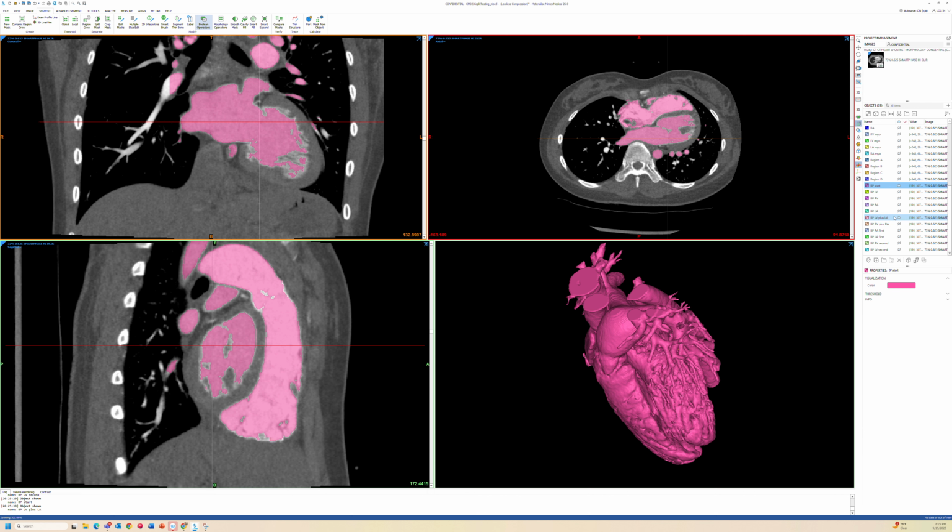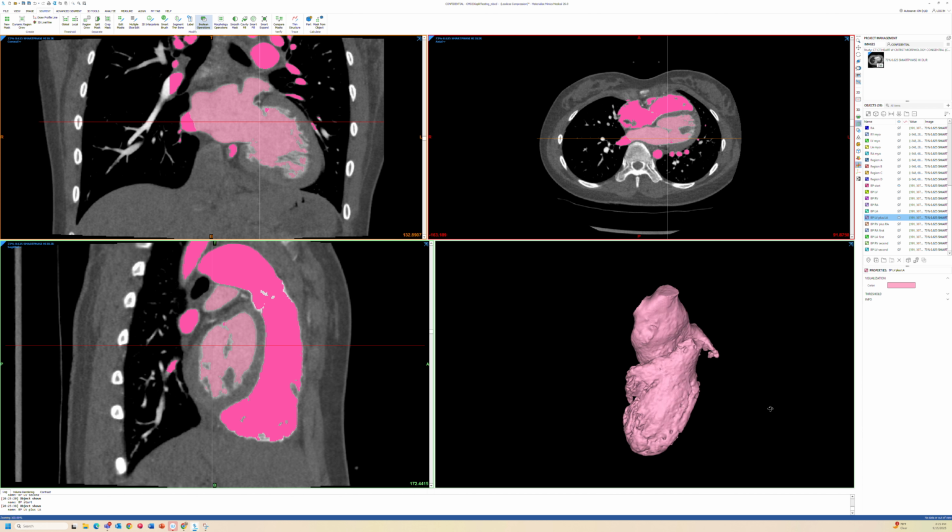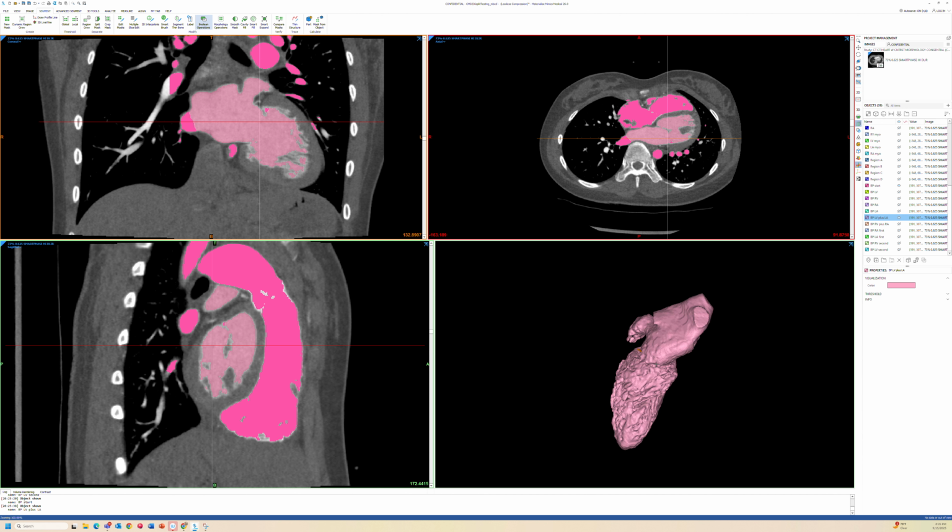let's start with the left atrium and left ventricle. So now I'm in a position where I just have these two. And now to get to that convex, this is the left atrium up here, this is the left ventricle down here, I can cut away. You can see on the blood pool where that line resides, and then we just cut away at that. And what that looks like when we're done is this. And so this is a final result.